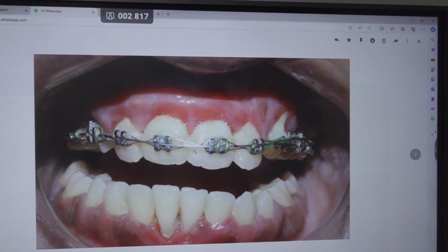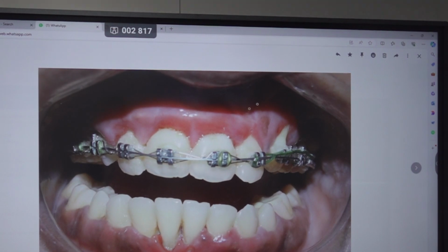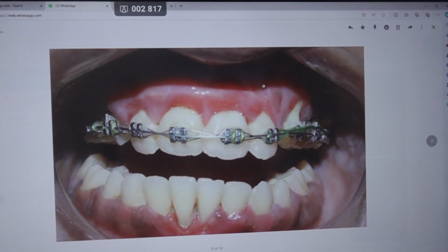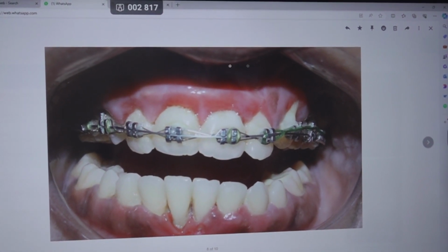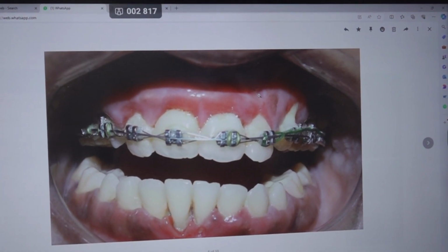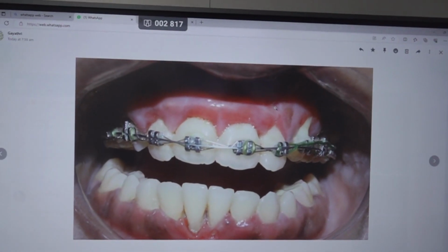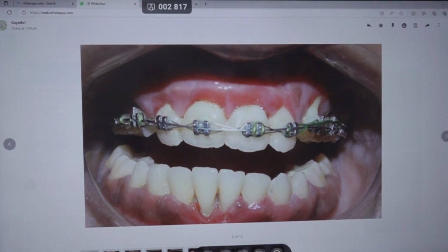So poor orthodontic planning is the first thing. Right? The canines are still inside the bone. How will the roots of the lateral and premolar move properly? Right? So these impacted canines are interfering with this movement. That will lead to either root resorption or bone resorption or untoward tooth movement. Either the canines should have been brought to the occlusal plane or they should have been removed. Right?